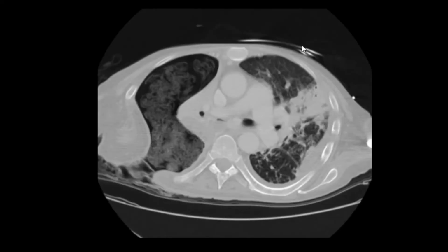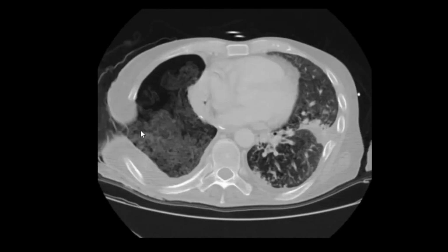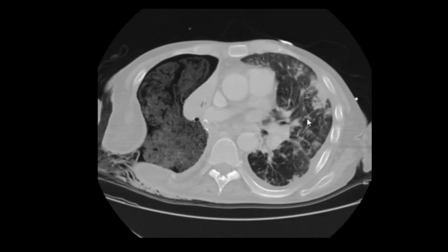This is a CT thorax lung window, and we see a large defect in the right lateral chest wall. We see all this gunk in the right thorax and some patchy confluent airspace disease in the left thorax. This is an example of an Eloesser flap. This is not an acute case. I told you in the prior video that 2 or 3 of these would not be acute, and this is one. It's one of the treatments for pleural empyema secondary to tuberculosis, which is usually the history here.